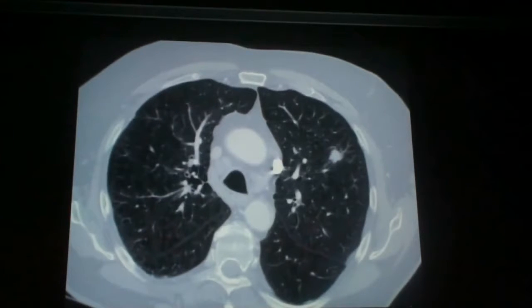The 2 other abnormalities are: there's a pulmonary nodule here, spiculated. It is more than 1 centimeter. What do you think it is? Cancer. Yes, it is a lung cancer. And I biopsied this nodule, and it was squamous cell carcinoma. So this is our abnormality number 2.